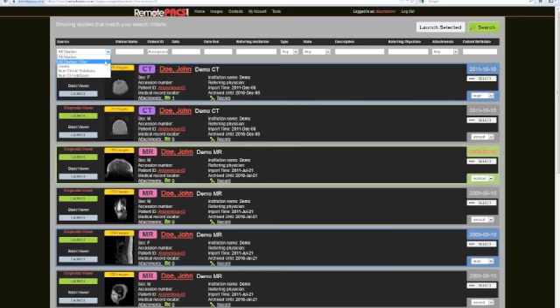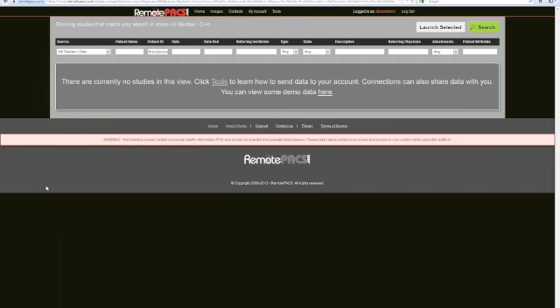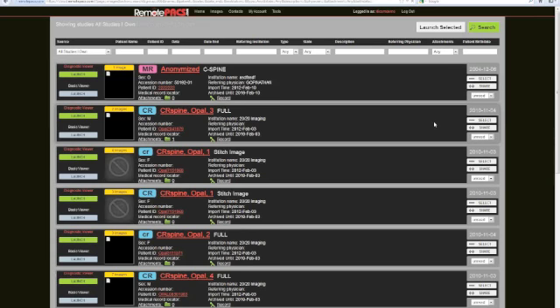One other thing, and I'm going to pull up some different studies here. I'm going to take a quick look at how to share. Now, we give you a couple different ways of sharing studies, and one of those ways is on a case-by-case basis.